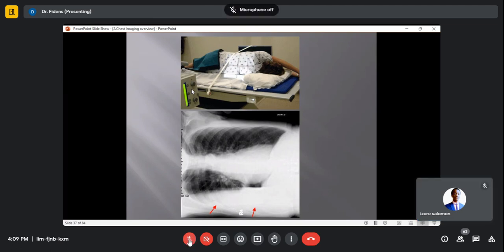The lateral decubitus. Maybe afite pleural effusion muri lateral side. I mean the right side. Why in pleural effusion? Aha, that's good. Can you see that this is now the left lung? That is normal. The left lung is normal. There is no pleural effusion. But when you come to this one, you can see the air fluid level.